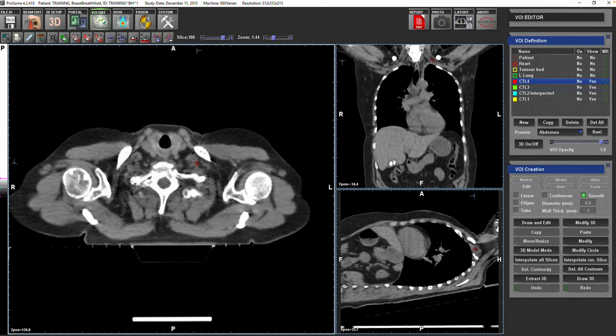So don't go for these details, but just go one slide above the subclavian artery, and then the subclavian artery arch, by the way, and then you will see this slide. If you are very familiar with the head and neck anatomy, or you did your head and neck rotation, you can also see my head and neck lecture or brachial plexus lecture, because you will need to familiarize yourself with something just posterior to the clavicle, and this is what we call the scalene muscles.